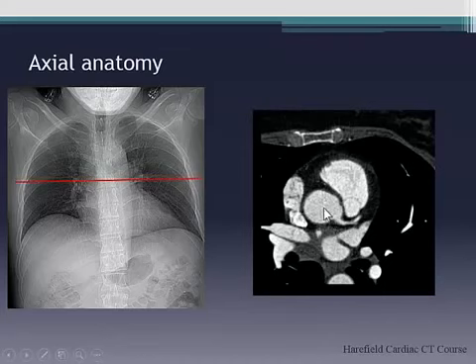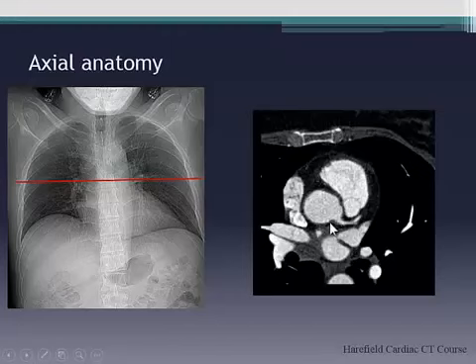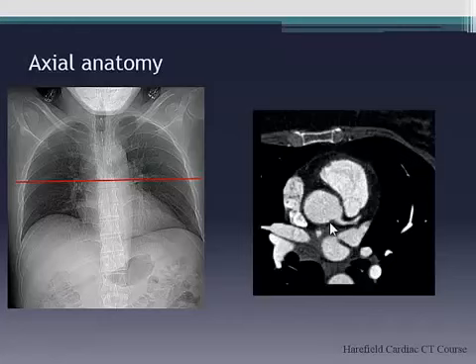Okay, moving down. Often what you'll see, because of the way the heart is angulated, is you often see the left main stem coming in first, or the left coronary arteries before the right, because the heart's tilted that way. So if you look here, you can see it's the left main stem. When you're looking at the origin of the coronary arteries, it's much, much easier to look at it in the double obliquity of the aorta.